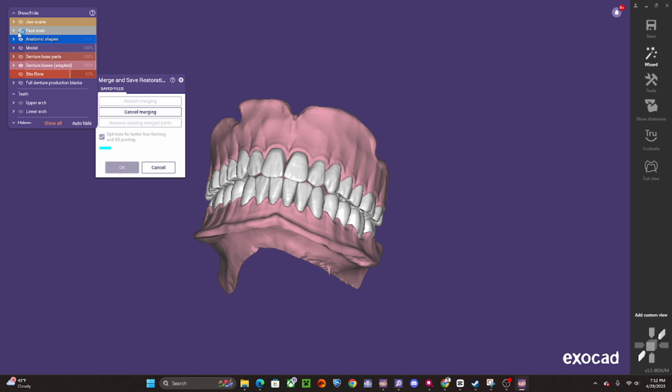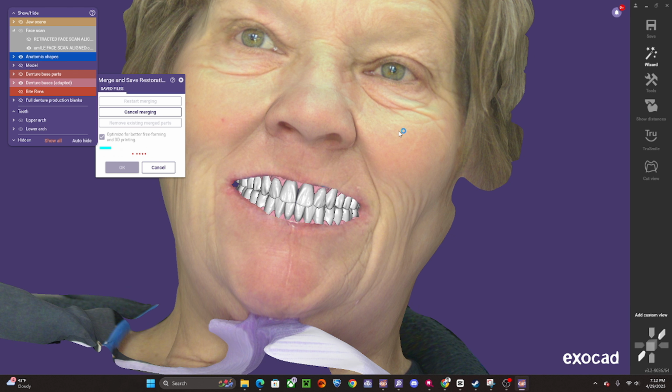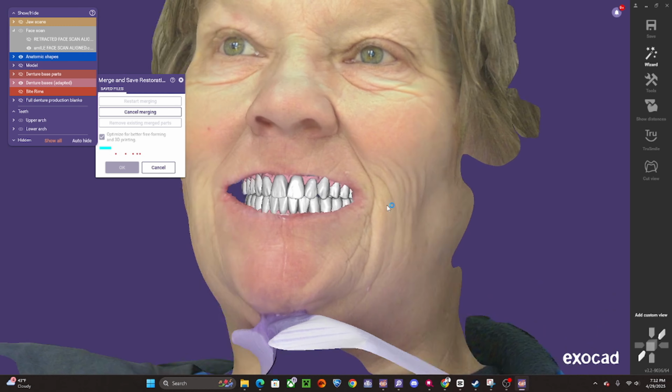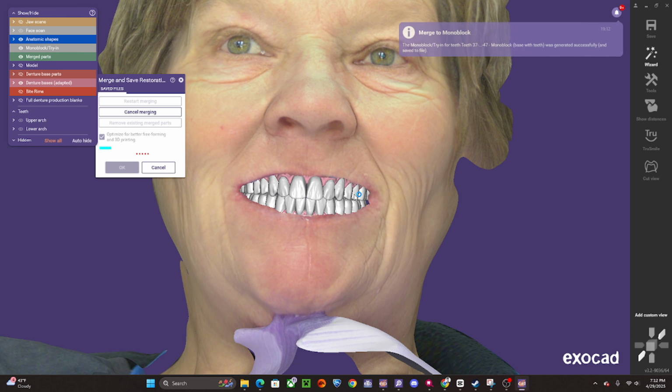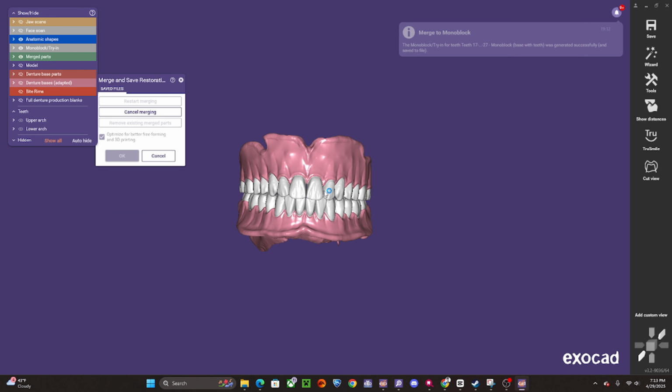And we have a maxilla and mandibular denture here for our lovely patient. And she'll get this try-in in. Print this out of a monolithic try-in. And verify aesthetics and occlusion and fit. And then we can bring this onto the mill. I have many cases where we go right from try-in right to finish. But also there may be some adjustments in between, something like that.